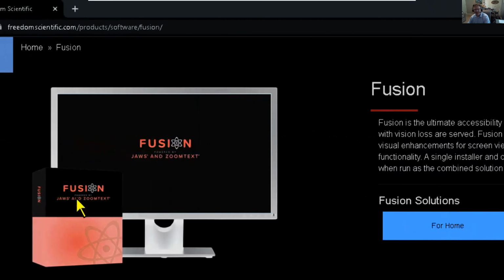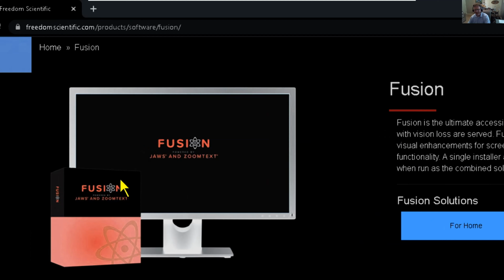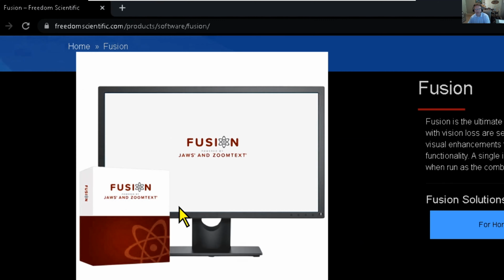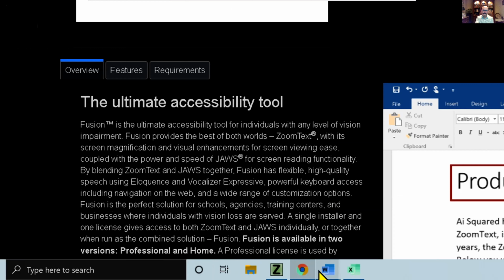If I reload, you can see how this is inverted. If I refresh the page, it should fix for us. There you go. That's what Mike's talking about. So your pictures won't be inverted. A couple of colleagues that work with me were super stoked when we released that. Yeah, it was released 2 years ago. Cool.